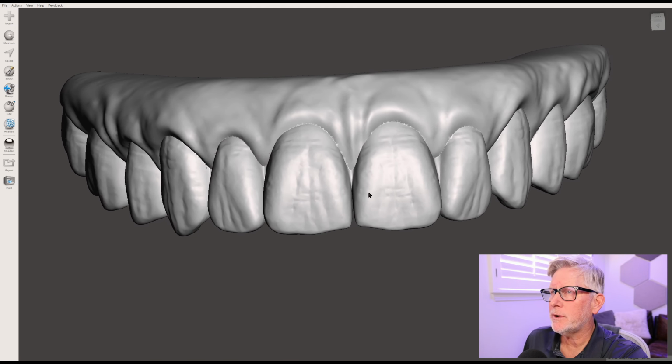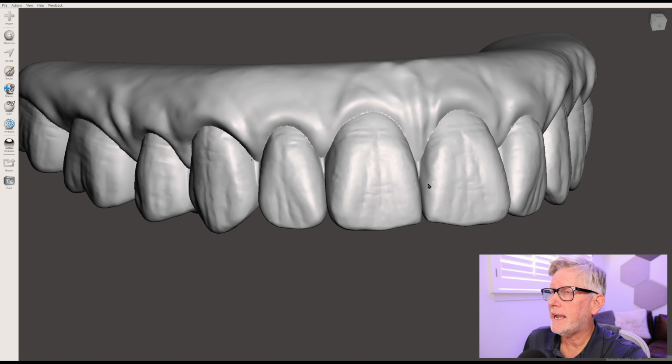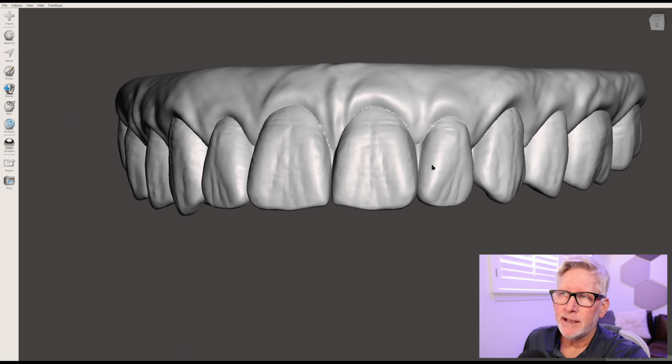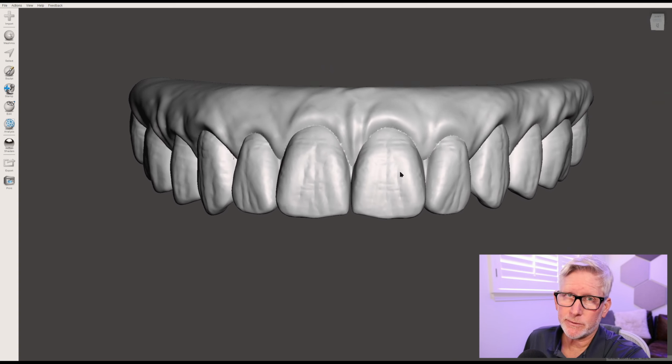It's a bit quicker, a bit more predictable. In the end, I can utilize them to connect the dots easily by preserving my pre-surgical coordinates and bringing in my surgical coordinates and connecting the dots and making some tie-base fixed restorations.